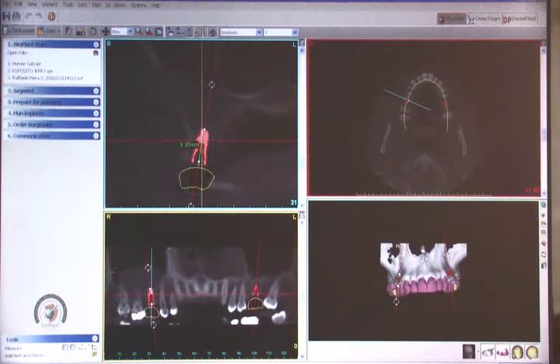So just to walk through the screens real quickly for those people listening that aren't familiar with the software, this is Implant, and the implant that you requested is Cybron, and I believe that your request was you're going to put Octa on one side and a Hex on another, just for educational purposes to show the differences in how you take impressions, but the implants themselves will be identical.